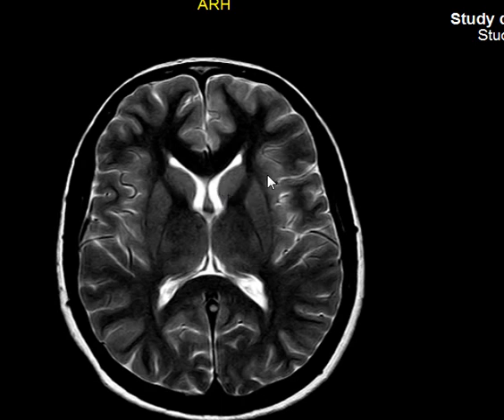Then you have this dark thing, which is white matter. This is the internal capsule. We'll talk about it later. It looks like two limbs. Posterior to it, you have this gray matter, the white thing, the thalamus. So you have the head of the caudate nucleus, the thalamus, and in between the two limbs, the lentiform nucleus.